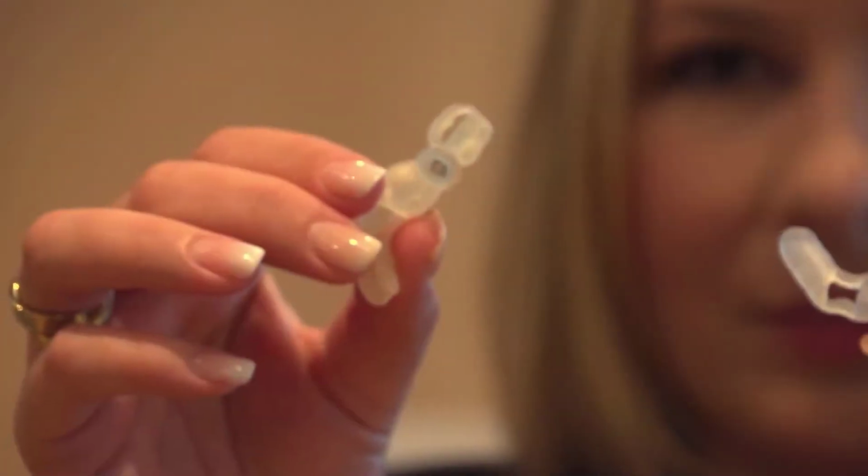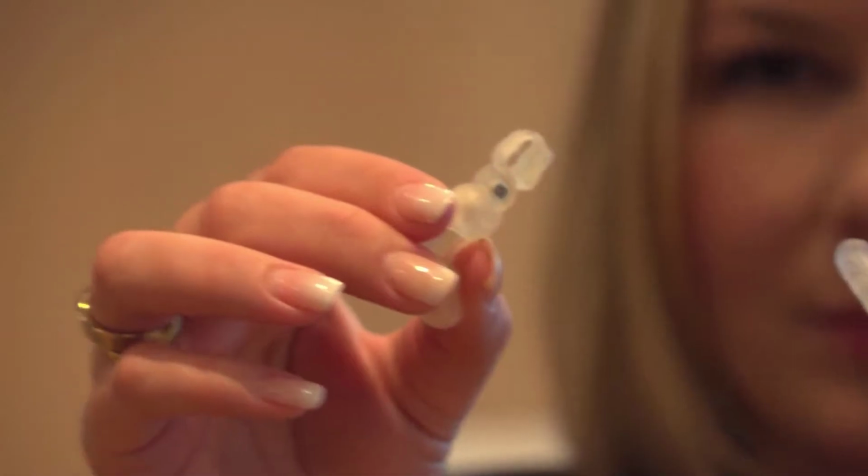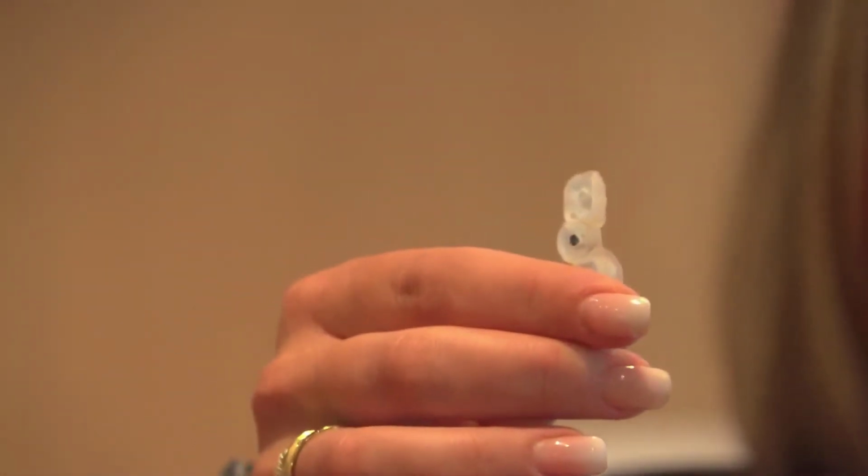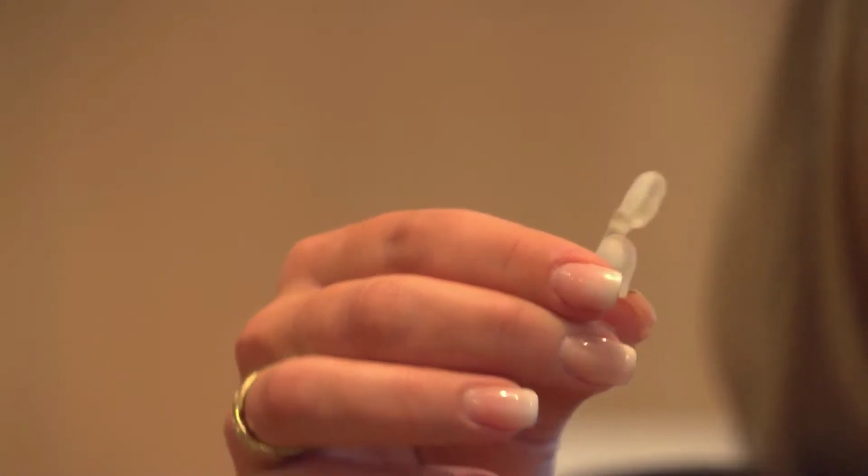So there are tools that are available. Usually a lab would do this, but there are tools that you can use to actually help put the sleeves in. Okay, and so this is like a cookery show, Udo says. Here's one we made earlier. Christian, do you want to do the before and after? So there's one with a sleeve in, there's one without a sleeve in, and that's pretty much exactly what we designed for this patient to do her surgery.